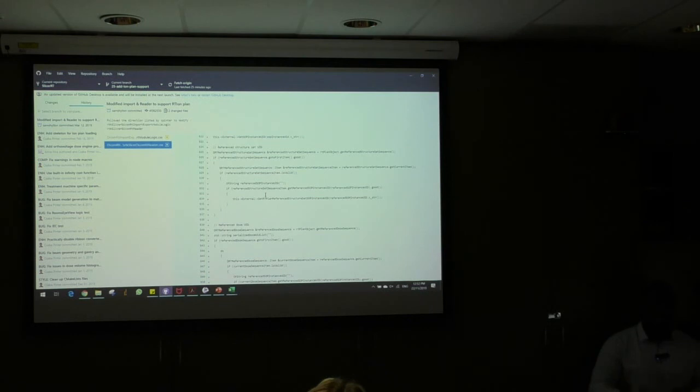This is one of the coolest things about Slicer: you can take the source code, modify it for your own application, change the formulas in there to what you want it to do, and then use it for your own clinical applications, such as workflows within the clinic. You wouldn't use it for treating patients, but you could use it for certain workflows like image registration.